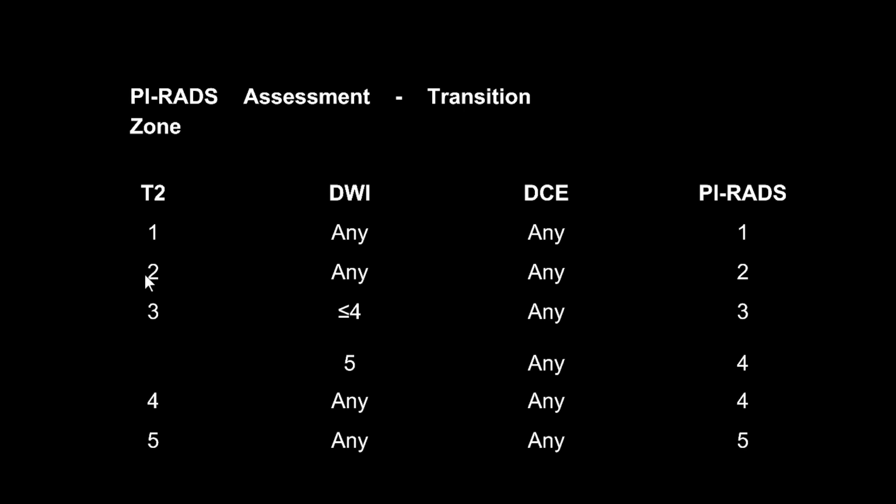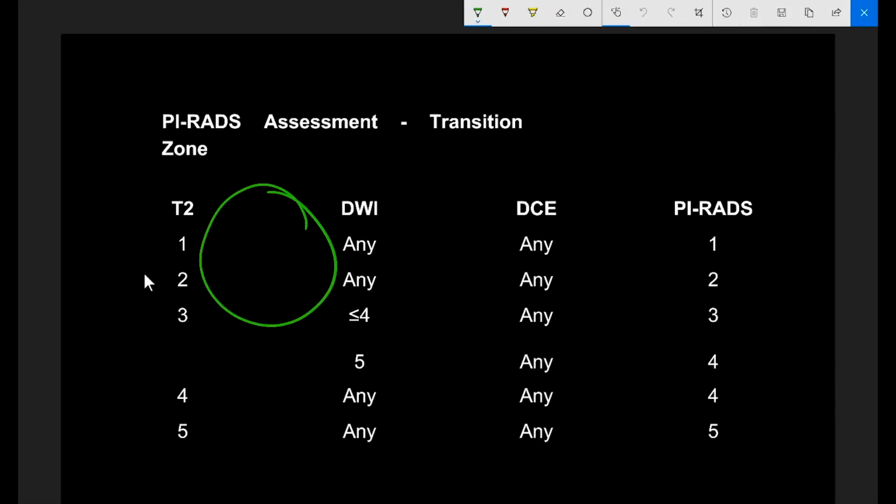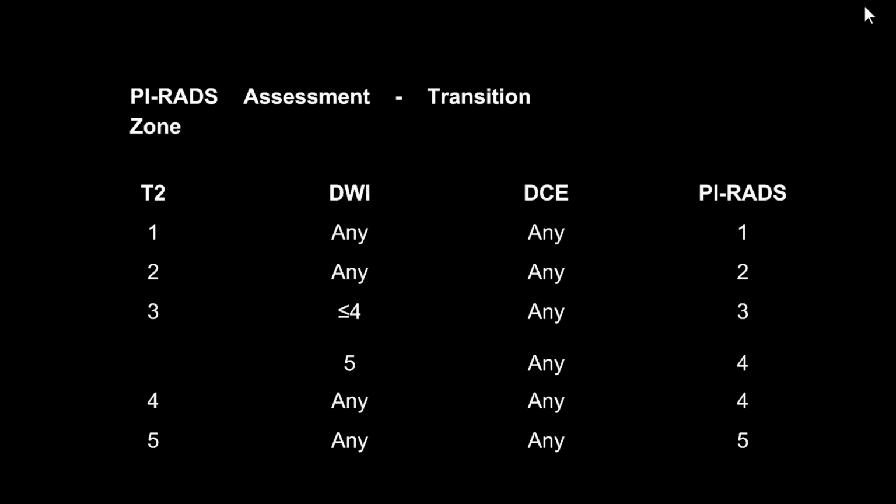A 2 is simply, within the prostate gland, you have well-encapsulated nodularity. Now, those nodules, it is said, are gray or intermediate, but in my experience, those nodules can be heterogeneous or even very, very bright. If it's a very bright nodule, they don't enhance. So that's another helpful little tool that's not really listed here. Bright nodules are almost always cold.